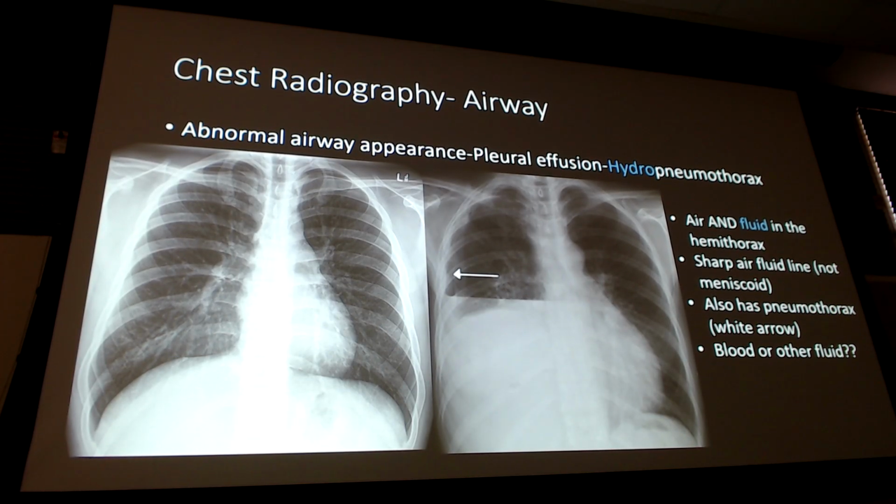Okay, so picking up where we left off yesterday was our last slide of our pleural effusions. This was that hydropneumothorax. Don't get so hung up on the pneumothorax. In the next lecture, we're really going to break down how we see those on x-ray. So when I pointed out the white arrow yesterday, if you didn't see that, that's okay. We haven't learned that part yet. That's coming later today into tomorrow in the next slide deck.